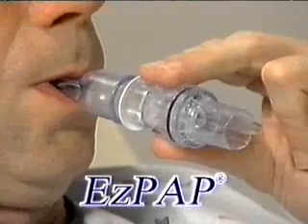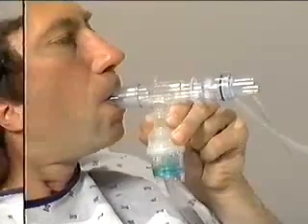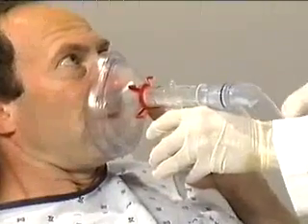Hello. In the next few minutes, you'll learn about DHD's EzPAP, whether you're considering it as part of your respiratory care program or because you've already instituted its use. EzPAP is a device that is indicated for use in lung expansion therapy and the treatment and prevention of atelectasis. EzPAP may be used with a nebulizer and is available in various mask sizes.